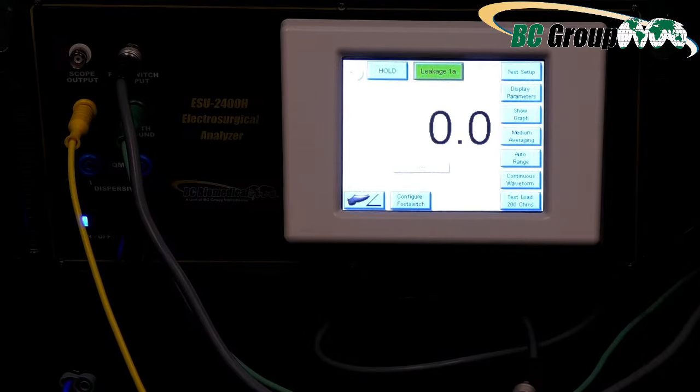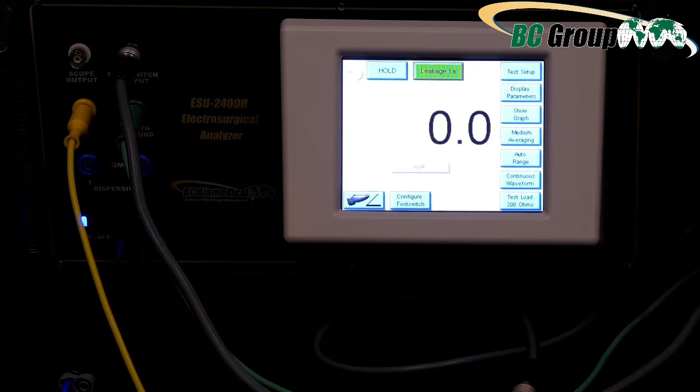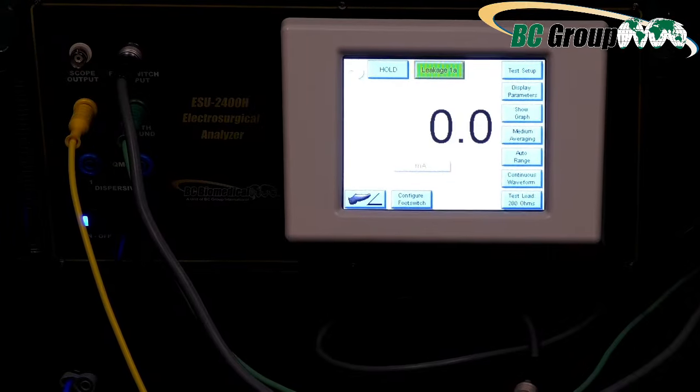Okay, there's one. Come on, Valley Lab. There we go. Okay, so there's my automated cable.